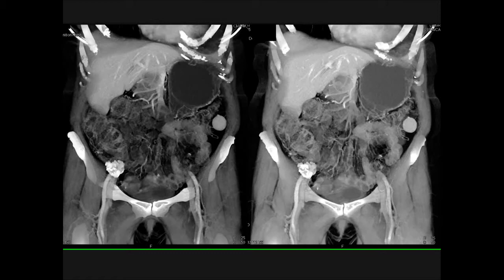Yes, you can think about a carcinoid, but that gives you a desmoplastic reaction. It's not so smooth. In a large node, that's a really strange location, and the node would have to be enhancing, and I see no other nodes. An omental implant, I guess you can consider that. It's a little bit to the left, but you can consider implants, but again, typically so round, so homogeneous. And once you realize that this patient does not have a spleen, you know you're dealing with an accessory splenule.